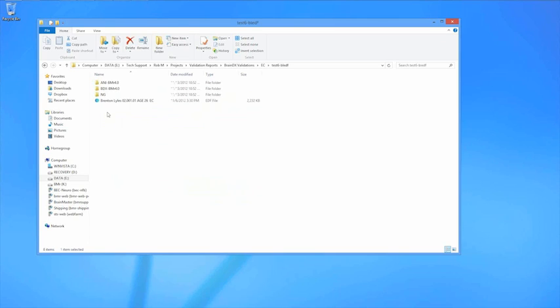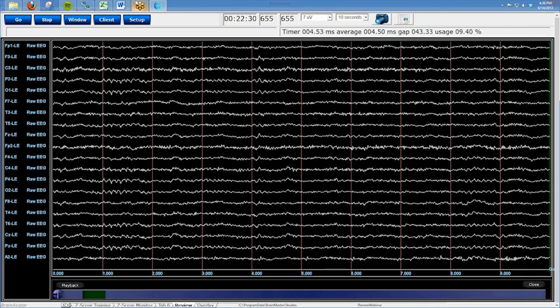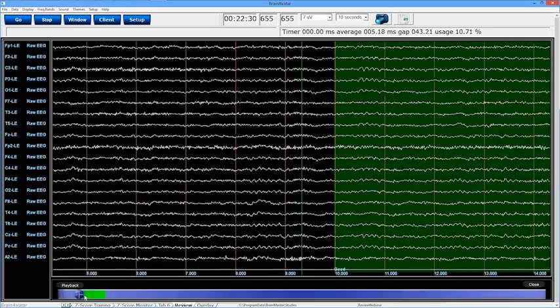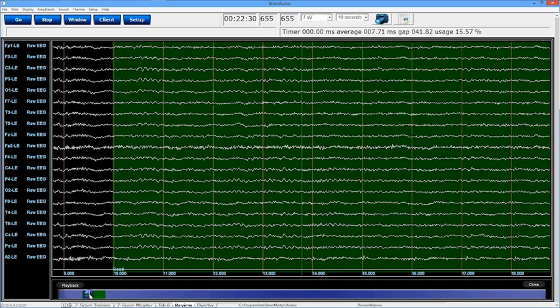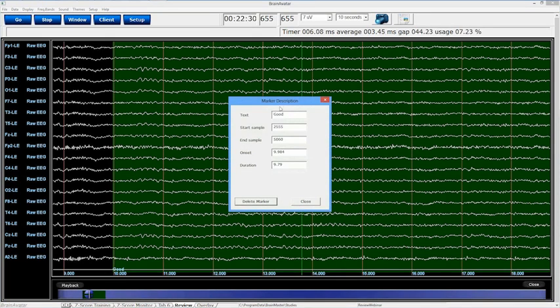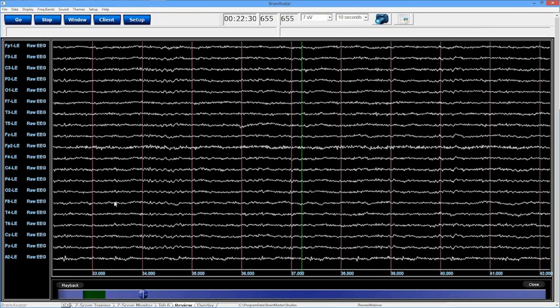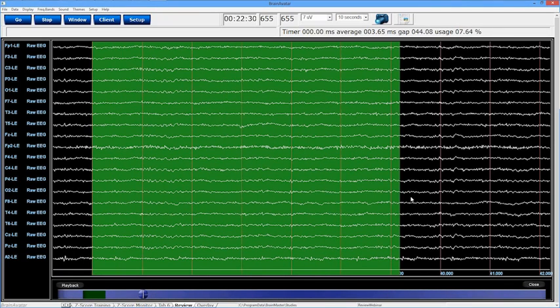All right. So I'm opening up a new EDF that has some information on it, of course, and there is a section actually marked out on it. Now what I'm going to do is, once again, delete that to start off with. As I told you guys before, the way to delete it is right down here. You're going to right click, you're going to see your marker description come up, and you're going to click delete marker. And of course it's not deleting right now. It could be because I made it in an older software.